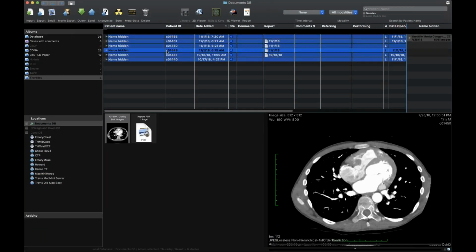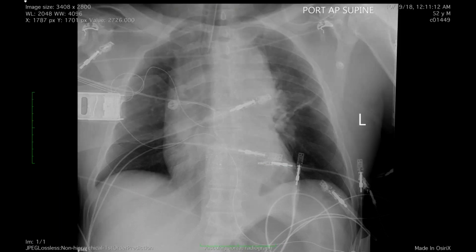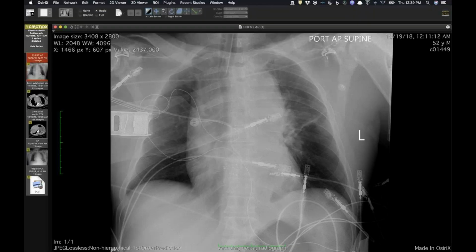Very interesting. All right, this is a nice one just because of the radiograph. This is a patient who had a witnessed syncopal event, was unresponsive, required resuscitation, and you can see when they come in that they're intubated. And of course, if I told you this was trauma, you'd believe it because you can see there's deviation of the trachea to the right, and there's loss of all of your left side mediastinal contours. So it certainly looks like it could be an acute traumatic aortic injury, except there's no history of trauma other than him just having a ground level fall.